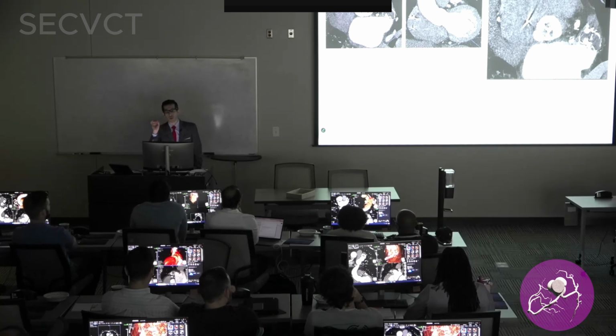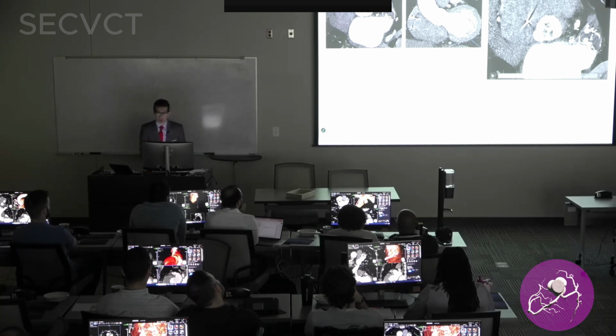I go by 0.23, 0.25 and above to be some degree significant. So if you see a big gap in the aortic leaflets and you know you're at the leaflet tips, you're not down, you have to be at the leaflet tips. Anything above 0.23, to some degree, I think it's at least moderate, if not more. And we did an MRI for this patient, it was severe.